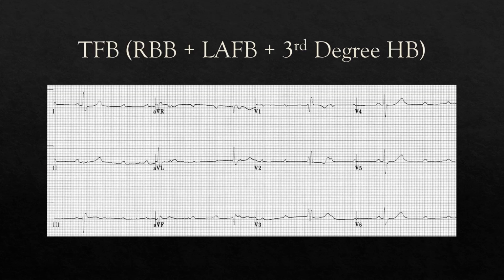So here's an example again, very ugly. So this is a right bundle branch block pattern. You can see that V1 is upright, RSR prime pattern, R prime being the largest. You have the slurred S wave in V6 with an overall positive QRS complex. You look over to your hexaxial leads, and you have a QR pattern in 1 in AVL, although again, kind of difficult to see. And then 2, 3, AVF have that RS pattern, although again in 2 and AVF that is very difficult to see.